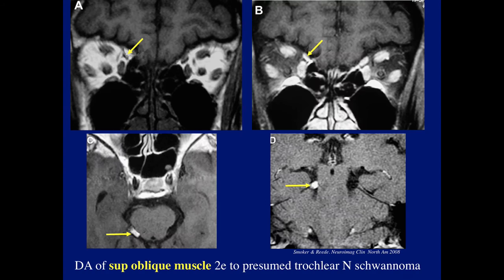What's wrong here? Correct, as Eric says, atrophy, superior oblique muscle atrophy. Everybody's saying that. Nate, Ben. And again, here's the normal side. And this is just to show the end result.